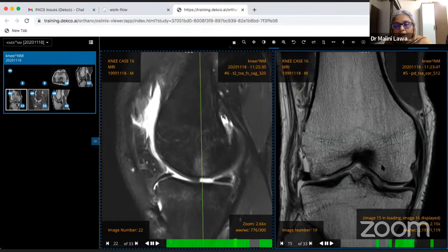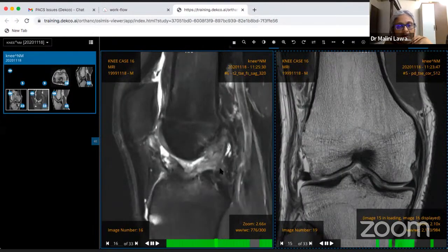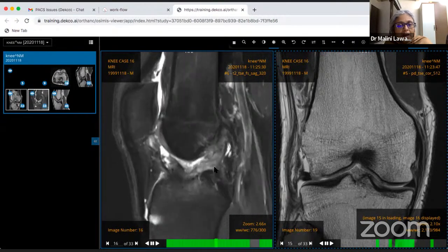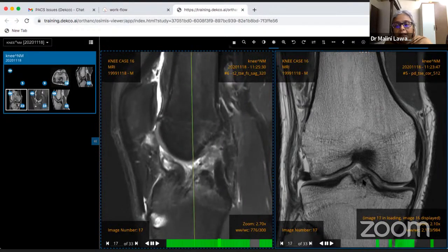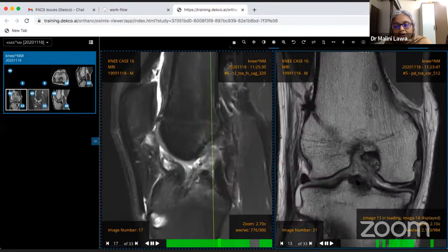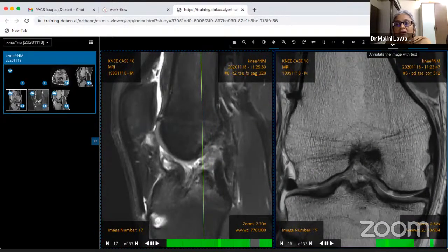as it is just loading. So this patient has an impaction injury at the anterior lateral femoral condyle sulcus terminalis. Also, if you can see, there is an ACL tear that we already spoke of. The graft has torn, high grade injury. Again, high grade, I don't see many fibers intact, only a few fibers are intact. And also I look at the cartilage. This is just loading a bit. Yes. So now can you see this cartilage defect out here very well?